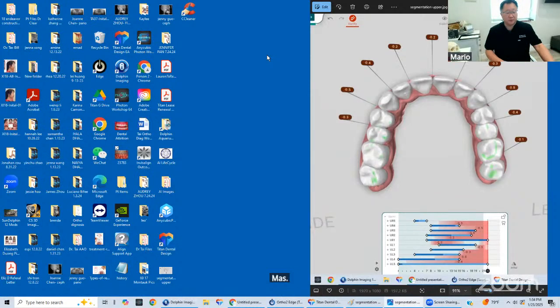I think the purpose of why we have what we have is to serve as a tool to remind clinicians that, hey, don't forget about the roots, right? Here are some virtual roots. Please understand that the roots are there. Don't just look at the crowns.